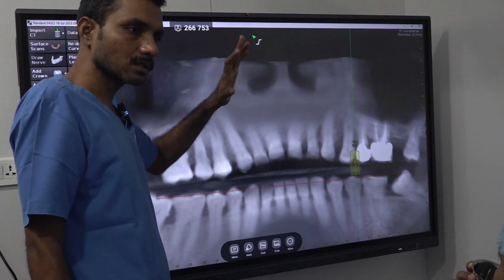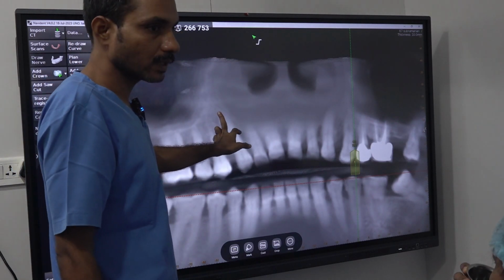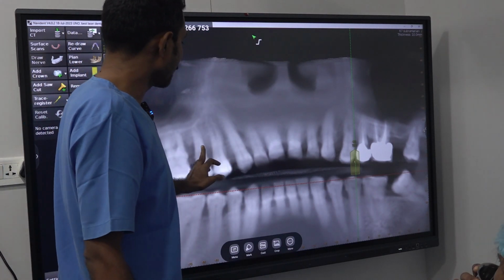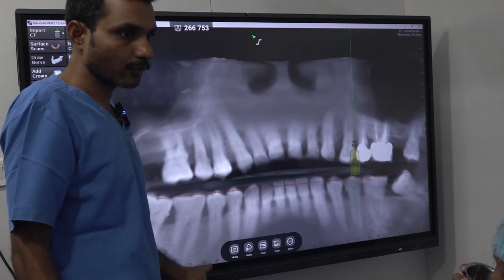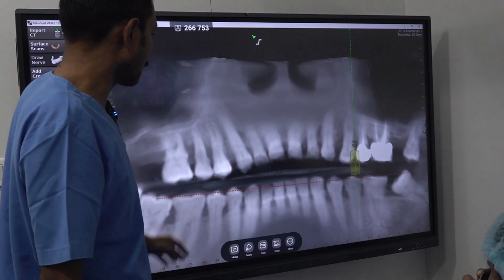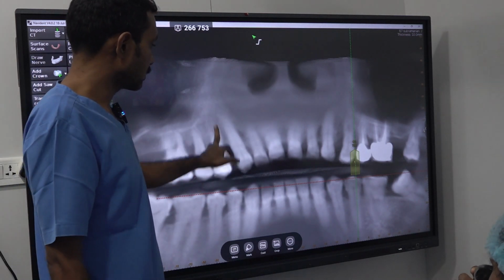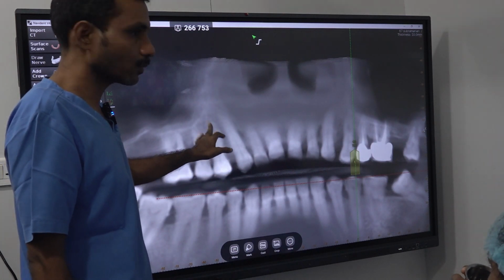The canine tip is buccal only. So palatally you can tilt and go a little bit, 10 degree, 15 degree, like how yesterday's case went. Tilted. Here the sinus is close, so either 5.5 or something like that is a better option. Here palatal socket, so after extraction, if there is good buccal bone, we can put a compressive implant.